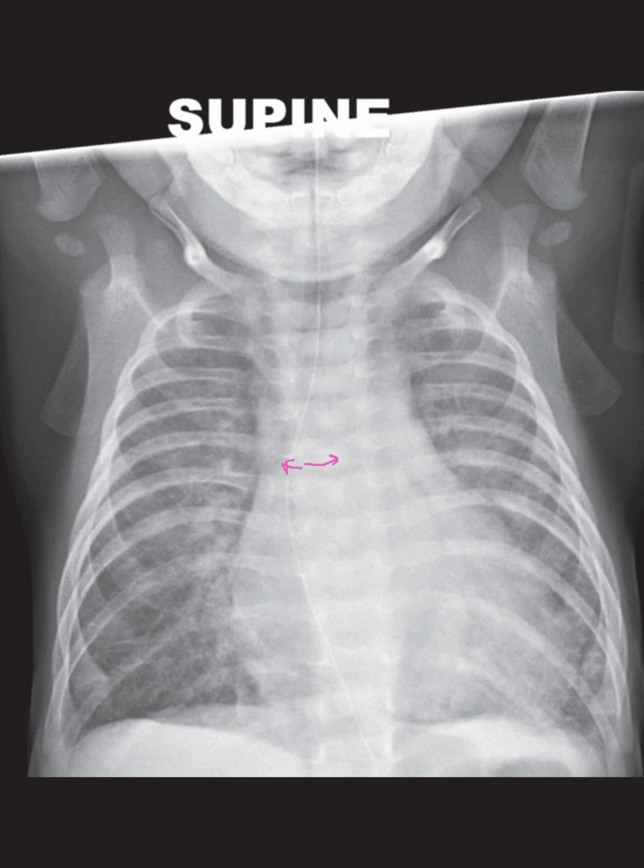Clinical features such as cyanosis, heart failure, and the patient's age are essential. In neonates, cyanotic heart diseases are often due to transposition of the great vessels, while in older children, tetralogy of Fallot is more common. We also need to consider signs like cardiomegaly and altered pulmonary vascular markings. Right to left shunts often present with decreased pulmonary vascular markings and cyanosis, while left to right shunts can increase these markings due to increased pulmonary blood flow.